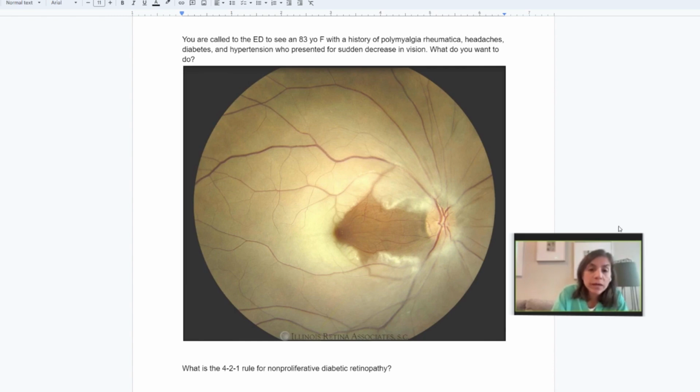The whole retina looks kind of whitish, likely edematous, with sparing of the fovea and the papillomacular bundle. So this is likely a CRAO with maybe a cilioretinal artery sparing. Okay. And then what would you want to order for, say, your CRAO patients?